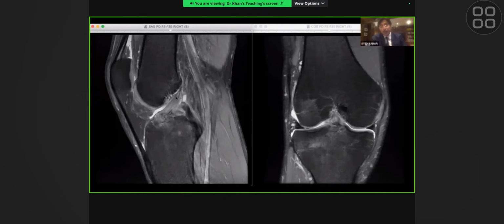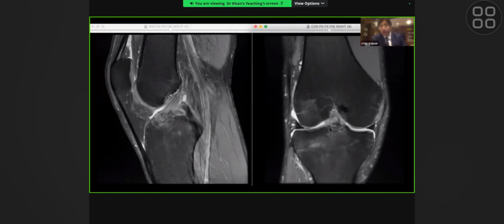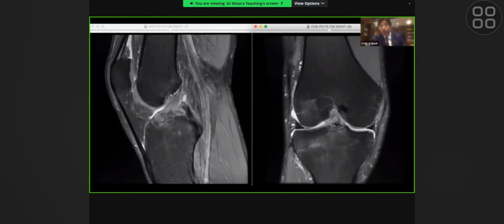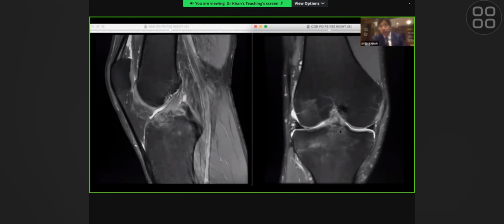You can see that here. Now, whilst we're looking at that, why don't we look at the coronal, because we've got it there on the screen. We might as well just have a quick look at the coronal. And this intercondylar eminence of the tibia does not look normal, because there should be nice sharp margins of the tibial spines in the intercondylar notch, and all of this marrow edema needs to be looked at. And we will look at the T1 in a second.